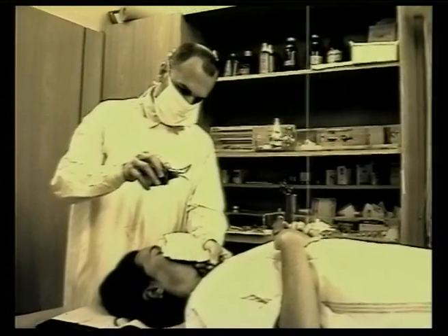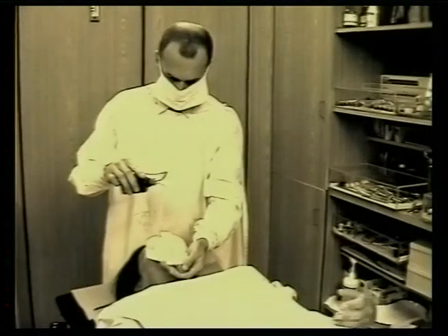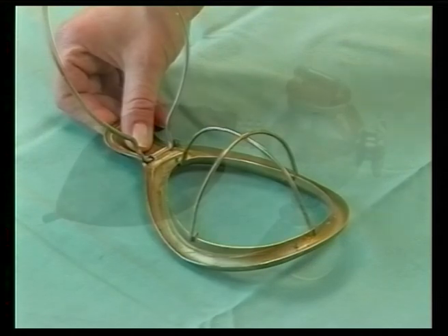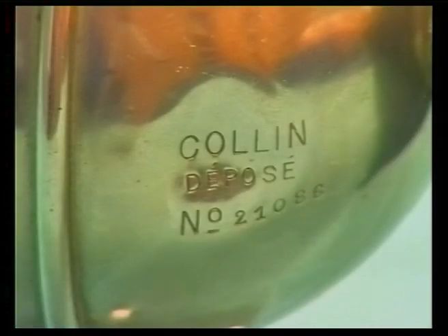The oldest systems were constructed so that the inspiration and expiration went to the atmosphere as with the Schimmelbusch mask. The mask was filled by a tissue and the anesthetist dropped ether on it. These aids cannot be used for novel anesthetics, and so special devices are used.